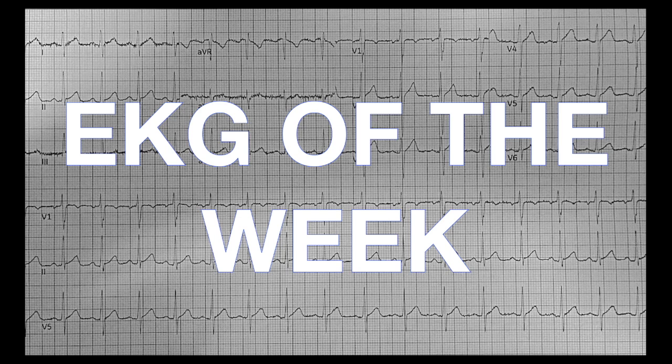So the idea is that we are going to walk through how to actually interpret an EKG, and we're just going to start with some of the basics, and we'll try to get into all the pathology and stuff, but this is just how to go through it. We'll try to stay out of some of the weird stuff, and this isn't designed as a master class. This is just repetitive reading so that you can learn to go through the essentially algorithm and maybe come up with a differential of what it might mean. Are you going to use all these? Are these real common? Are they going to necessarily change your practice? No, not all the time, but it is something that you ought to be able to do.